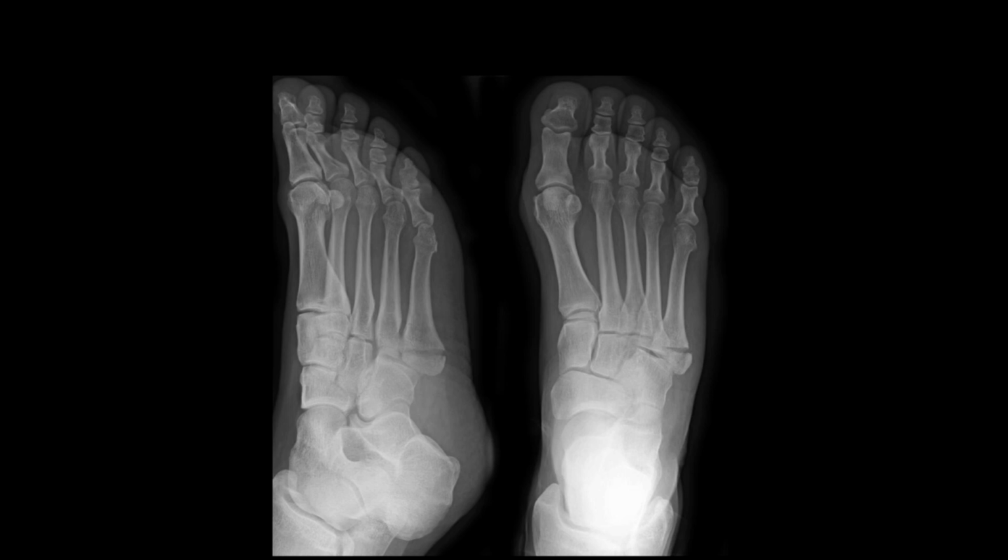So moving on, looking at our first x-ray again, I want you to pause this, go through the system that we've used, and we'll go over it. So hopefully you'll have had a look, and again, jumping to the most pertinent findings to prevent this session getting longer than we need it to. Hopefully you'll see, once you reach the fifth metatarsal, that at the base we have a fracture here, at the apophysis of the fifth metatarsal.